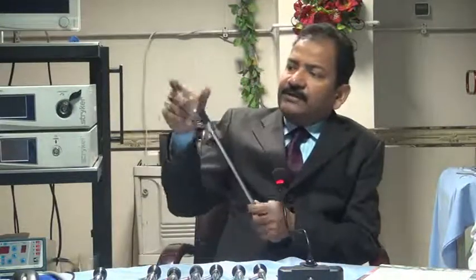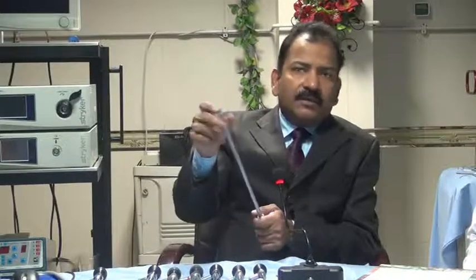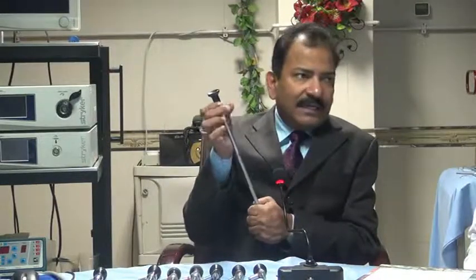And if you see here, this is called the eyepiece. The eyepiece is to see. This is called the object lens. The object lens is to take the image. And this is called the light adapter. A telescope has three important properties: one is diameter, another is optical axis, and third is the number of rod lenses.